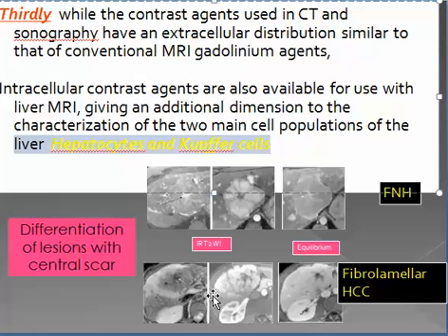These can be differentiated by the intense enhancement that occurs early in malignancy, which soon washes out, and here there is a definite scar inside. As seen in inversion recovery T2 weighted images, while an equilibrium is reached in delayed phase.